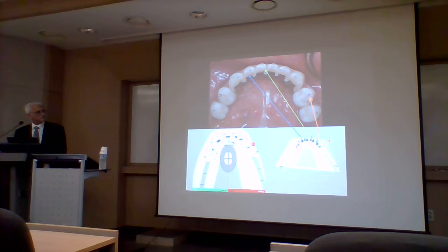객관적으로 측정이 돼 있는 걸 가지고 해석을 하는 거기 때문에 감각에 의존하거나 그런 거 없이 주관적으로 해석하는 것보다는 사이언티픽하다고 얘기할 수 있을 거고. And the newest version actually has an implant warning feature that will tell you if there's an implant that's being overloaded. And that way you can be drawn to it automatically by software marking it for you.